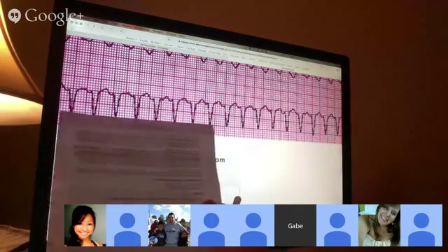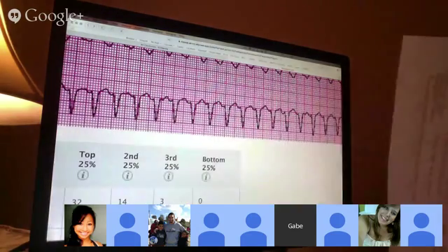So what makes the jagged sides of the QRSs? You're talking about the upward and downward slopes? I think that's just aliasing and how it was scanned.